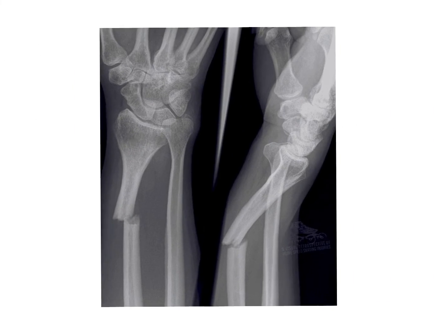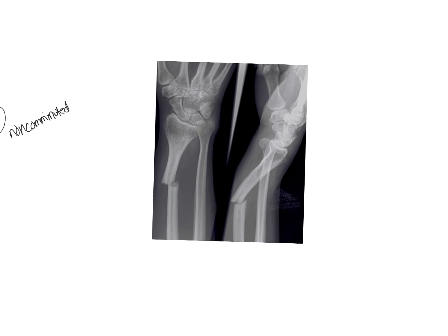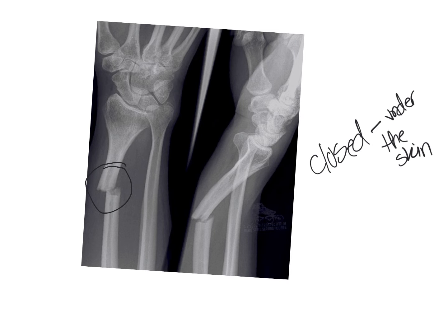Okay, so let's move on and just take a look at a few X-rays here. In fact, let's compare them to our list here and see if we can identify what's going on. So in this one, the main fracture we're going to be looking at is right here. It looks like it's a closed fracture. Now, closed means that it hasn't pierced through the skin, so it's still under the skin. On the other hand, the other side of that would be open, so meaning it's pierced through the skin. And it's close here. We would need to see the patient to be sure, but it seems like we still have some skin intact, but it's getting close there.